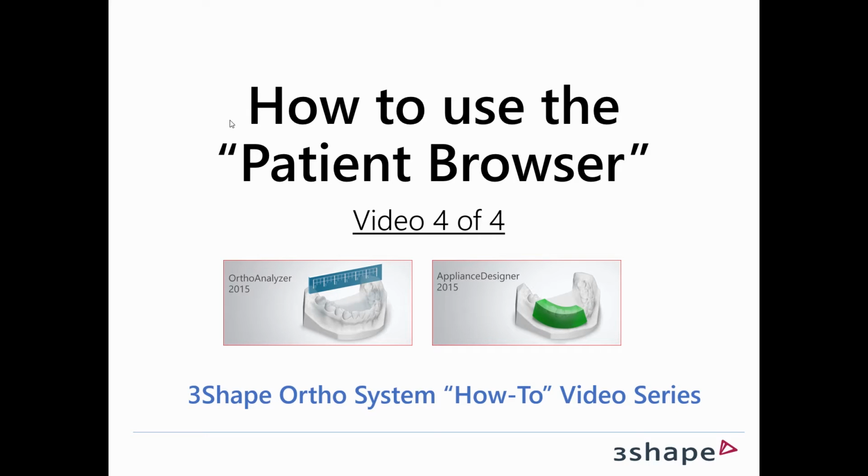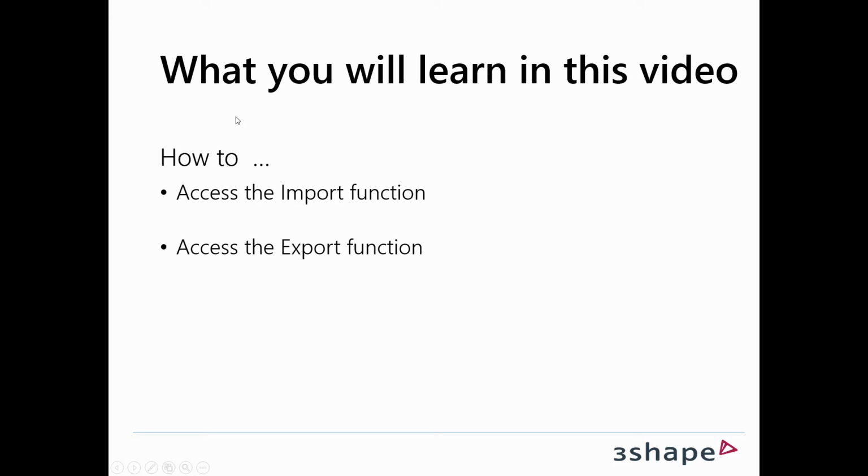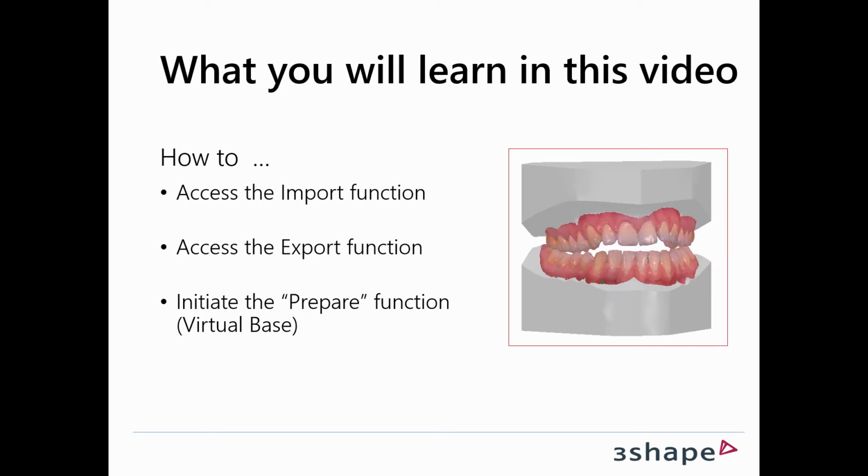Welcome to the fourth and final video on how to use the patient browser in the 3Shape Ortho System. In this video you'll learn how to access the import and export function, and also how to initiate the prepare function, allowing you to do a virtual base like I have on the picture here.